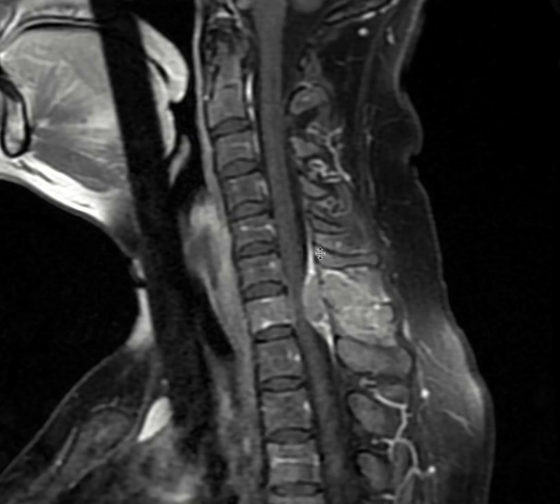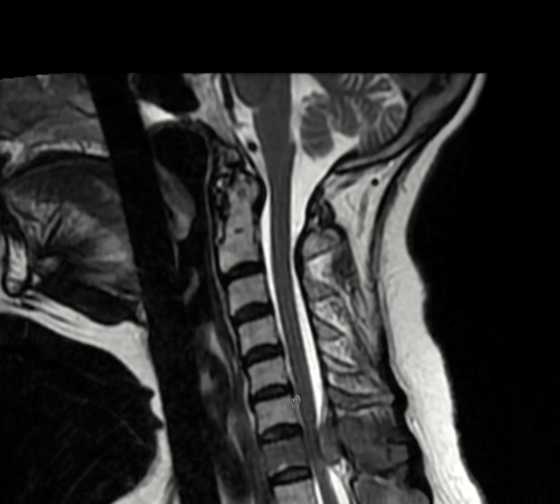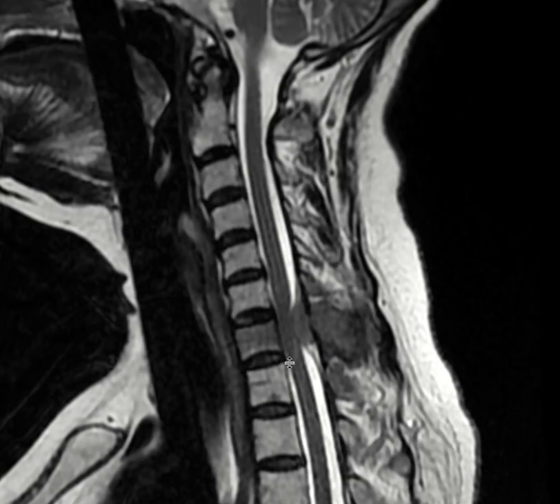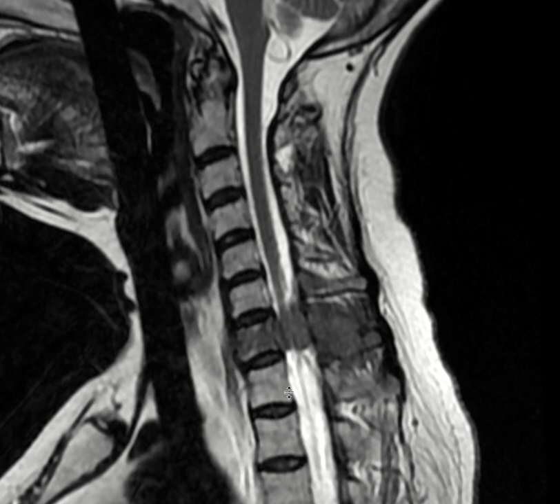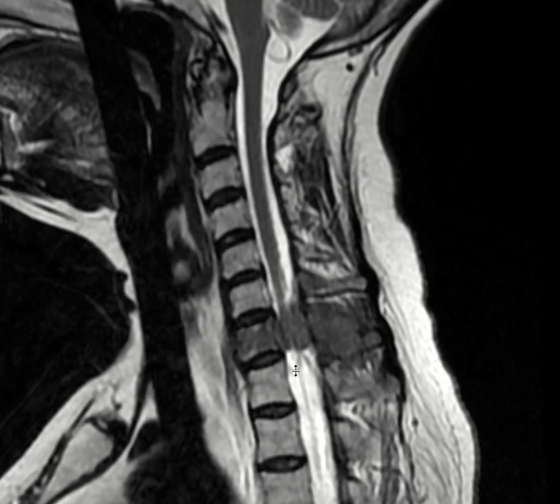and also the most important finding is epidural involvement. So we have this epidural metastasis within the posterior aspect of the cord that is extending from C6 to T1 and causes cord compression. Although I don't see any abnormal signal at this point, this is a severe cord compression and severe spinal canal stenosis that can cause patient symptoms right now. So this is kind of a neurosurgical emergency.